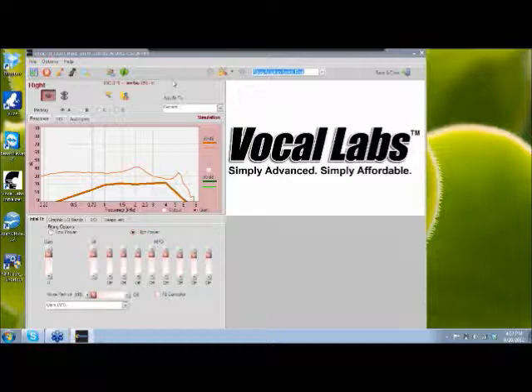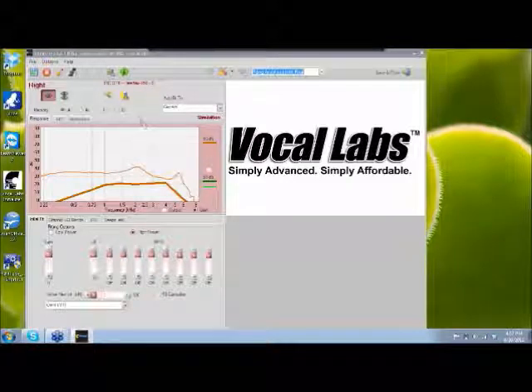For our purposes, say we just came into this software, we detected our hearing instrument. The very first thing that you want to do is go down here to your fitting options, high power and low power. These are the different receiver options that are available for our RIC products. If you were using a BTE, you would have ear hook or thin tube options available. You want to pick this first because it's going to affect everything.